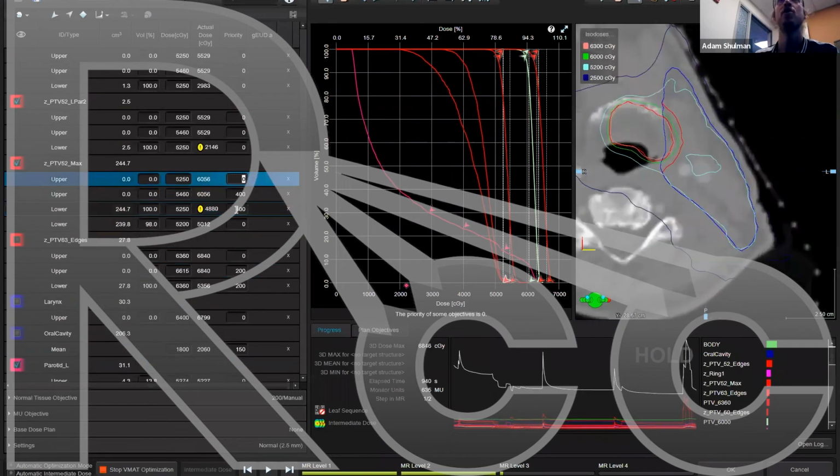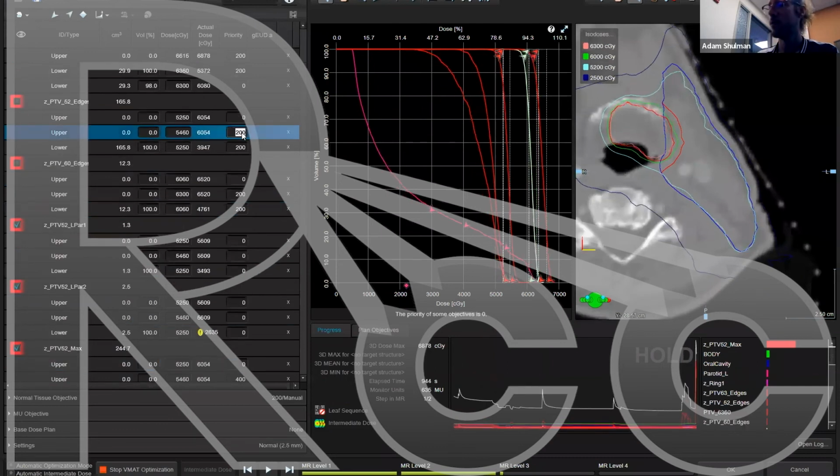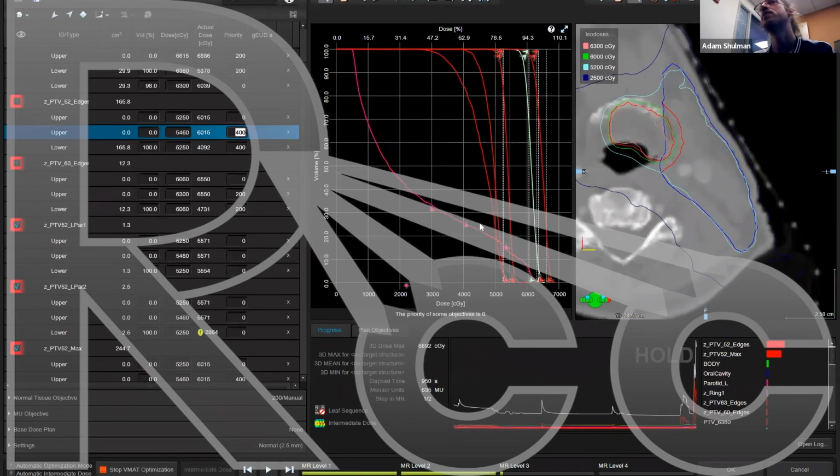Let's really get coverage of this thing. There it is. Okay, my parotid got a little bit worse. And so this is just a small example of what happens if you've really pushed it, and my parotid might be way down here, and I optimize. Sometimes you can lose all of that work in that gross alignment of MLCs just because I didn't lock my parotid down. So you want to lock it down.